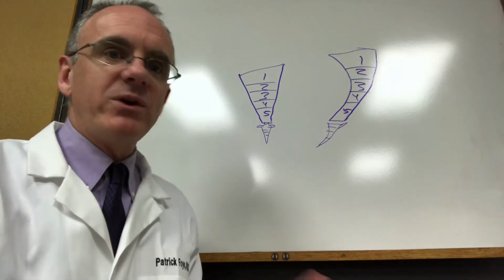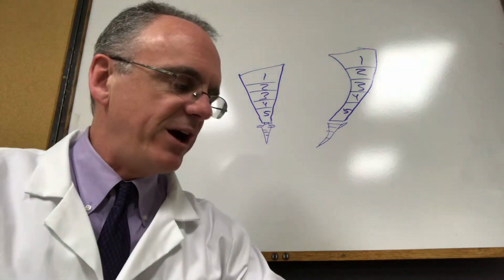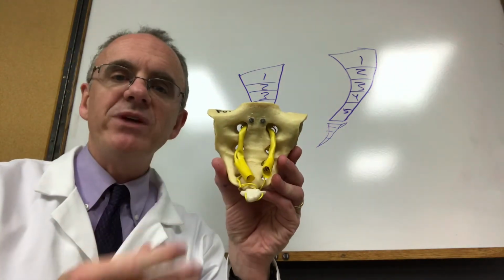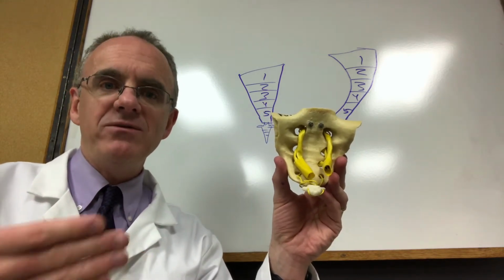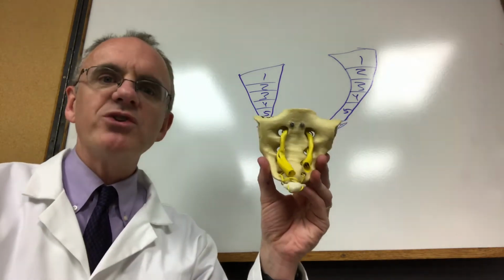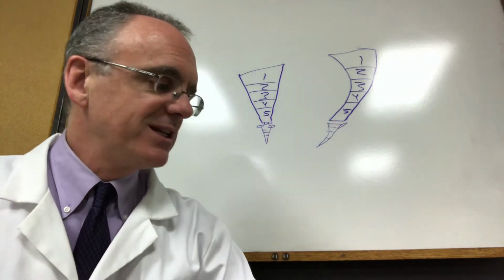So, how is this relevant when it comes to getting the proper X-rays? Well, if you get X-rays that are done in the front view, in medicine they call that a frontal view, or they may call it an AP view, for anterior to posterior. Then there are some things that can come in the way of getting a good view of the tailbone. So let's take a look at those.